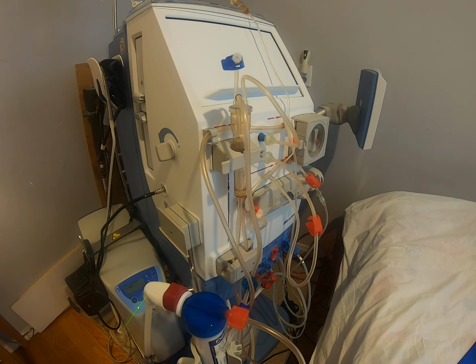After the processes of ultrafiltration with transmembrane pressure and diffusion, the dirty dialysate will come out here and be collected by the red hose. Let's trace it again, out here to the red hose and to our sewerage. So the movement of dialysate in the dialyzer is from the bottom upward.